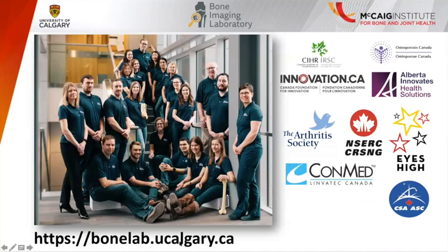I welcome you to go check out bonelab.ucalgary.ca, and of course to go check out the normative site. But what I'm going to quickly show you is an example of actually running the site. So let's go.